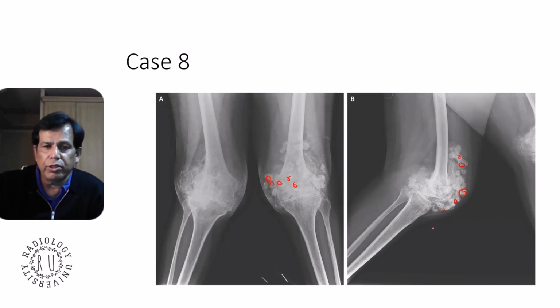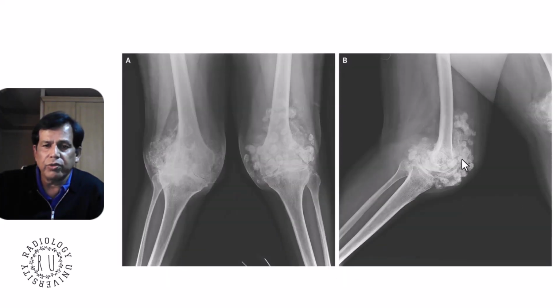But the main pathology is that the joint space is normal, with a lot of opacity surrounding the joint, with very clear cortex. Those who have seen it once will know this is called multiple loose bodies, osteochondromatosis. So this is synovial osteochondromatosis. In an exam, if you get this, this is a case you should definitely know, recognize very quickly and move on. So, synovial osteochondromatosis.